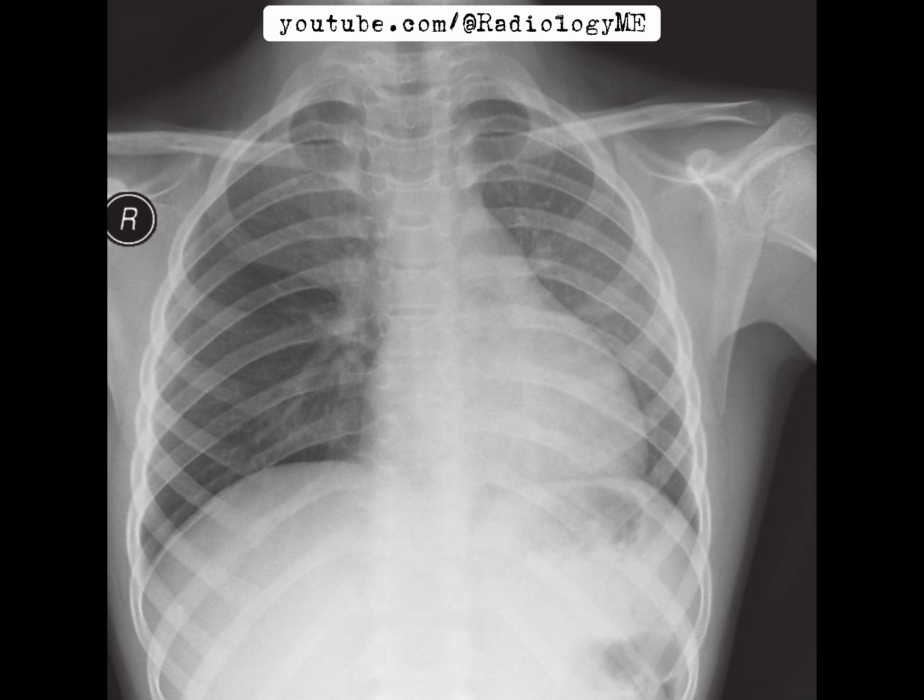Typically, correlation with the clinical history would be incredibly helpful here, but based on the radiographic appearance alone, I'm leaning towards the most likely cause being an aspirated foreign body or mucus plugging. Now, foreign body aspiration, especially in children, can often present this way. Kids tend to aspirate objects like peanuts or small toys. This radiograph is suggesting air trapping in the right middle and lower lobes, which is a classic pattern for a radiolucent foreign body.